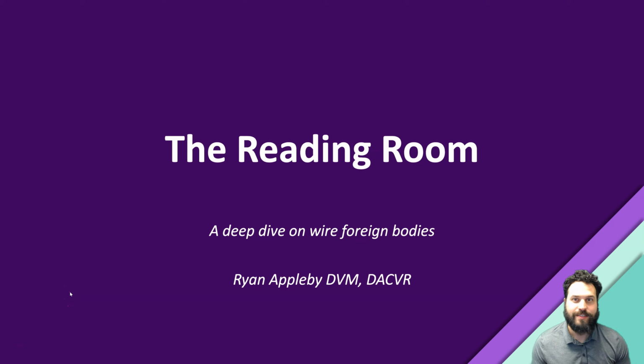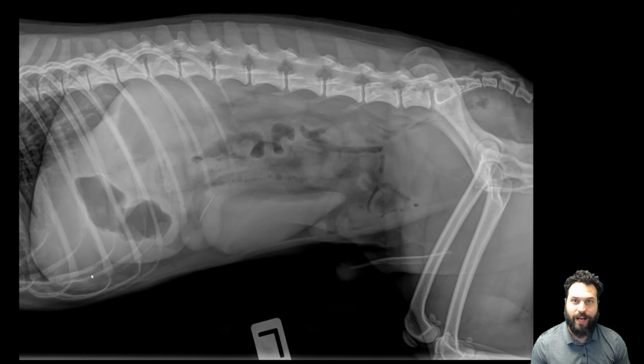I'm Ryan, and this is the series where we go through common or at least interesting cases in small animal practice, and discuss the radiographic findings to help you improve your veterinary practice day to day. So today we're going to take a deep dive into a really cool topic, I think, which is migrating wire foreign bodies. Some of you may have encountered these previously in your practice. They look a little something like this. You've got this wire, oftentimes in the abdomen, and the question that we often have clinically is, what does this mean and what should we be doing about it?